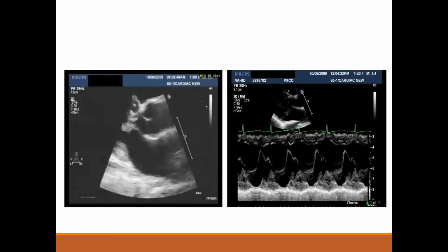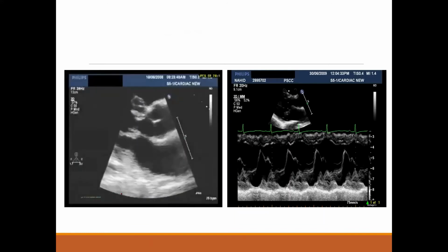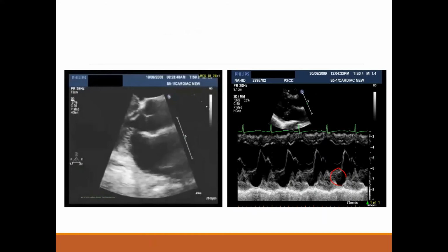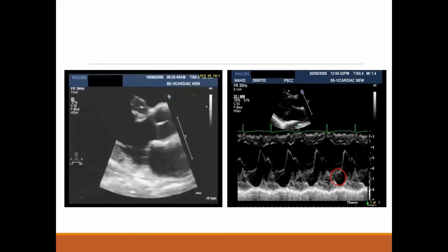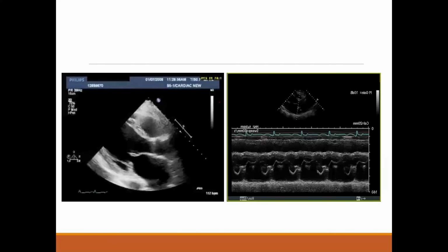Again, this is a mitral valve prolapse. Again, the same prolapse, and you see the prolapse is also showing here in the M mode. You know, it's late systolic prolapse, as you see here. Okay. Now I need some diagnosis here. Who can take this? Who can take it?